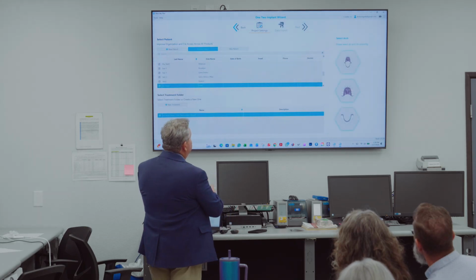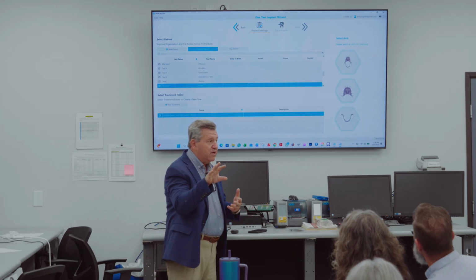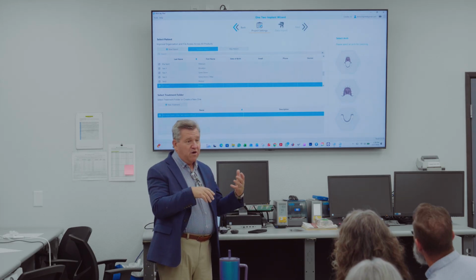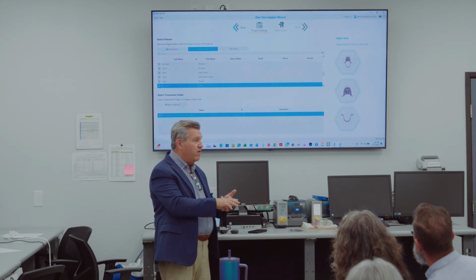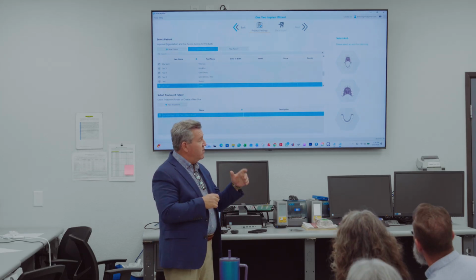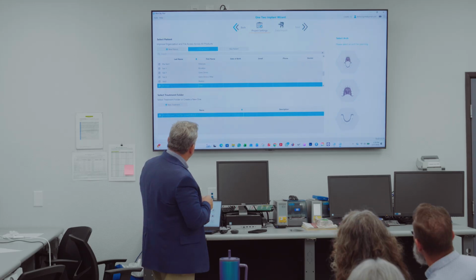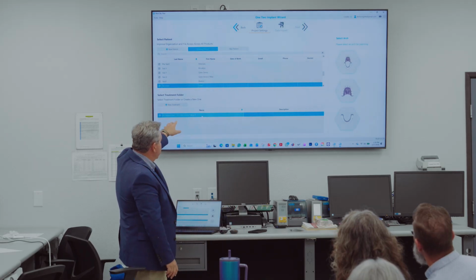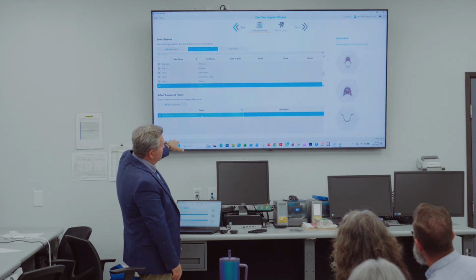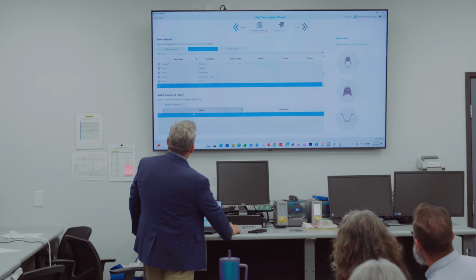If you're doing a patient, you put the other vital information in there, because all this information is gonna be transferred to Lab Pronto. Lab Pronto is our concierge service who provides fabrication of all these things, crowns, implants or whatever. It goes through Lab Pronto, so all this stuff is uploaded directly into that. All right, so now this patient shows up right here. You're gonna have a whole list of patients here as you develop your caseload.